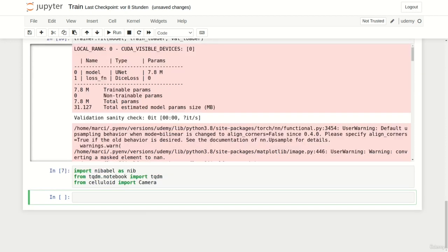At first, we create a new instance of our model and load a checkpoint. Let's define a variable called model, to which we assign the model returned when calling AtriumSegmentation.load_from_checkpoint, to which we pass the weights path. As mentioned in the last lecture, we directly provide multiple checkpoints. Let's use the most recent one for evaluation.